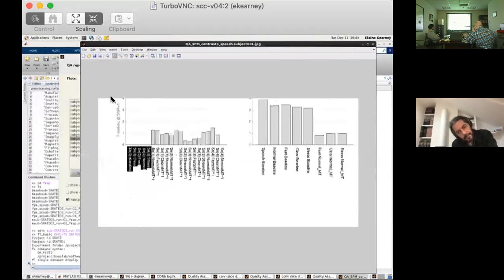And remember, this is the design where for baseline, if we just want to look at each contrast versus baseline, we did not add a duration covariate. We just wanted to look at the difference between the response in that speech condition versus baseline.